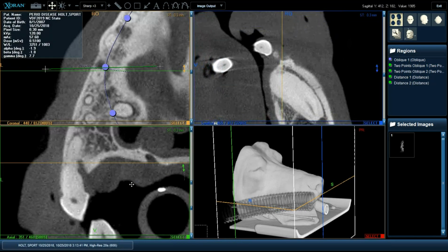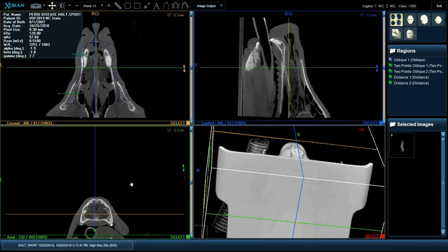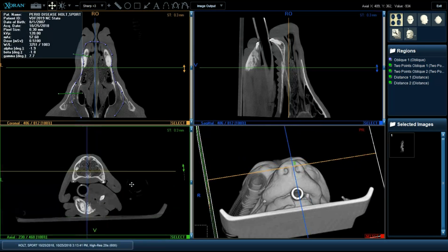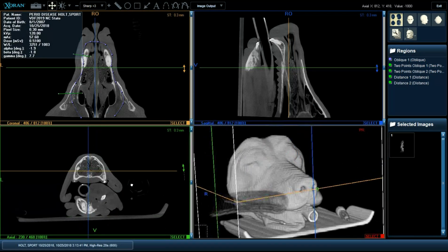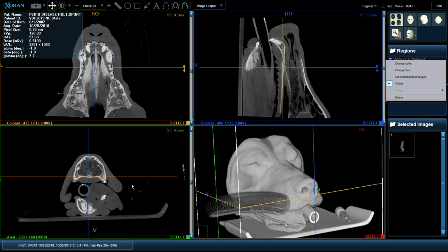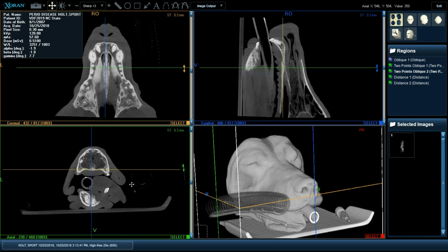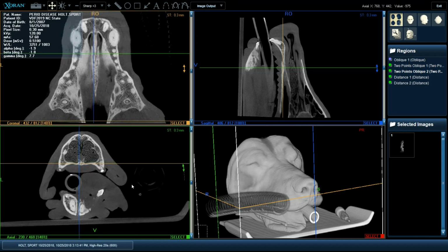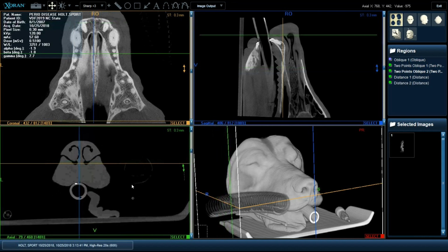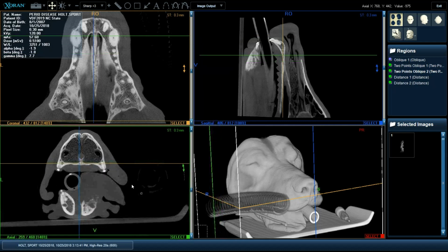We can always go back to the basics and recenter ourselves if we're a little bit lost. I just jumped right back to the very beginning of the scan itself, the way it would present if you had just scanned the patient. This is what you'd see exactly, just not those cuts here. Let me take this out. So this would be, again, how the patient would present on the images as soon as the scan is completed. And from there on, we would look through the actual views. This is what I like to do. Seems to work pretty well.